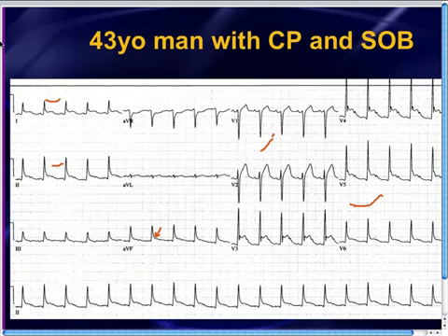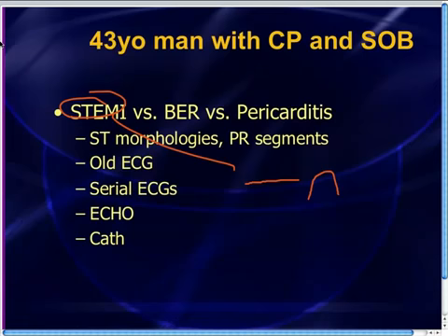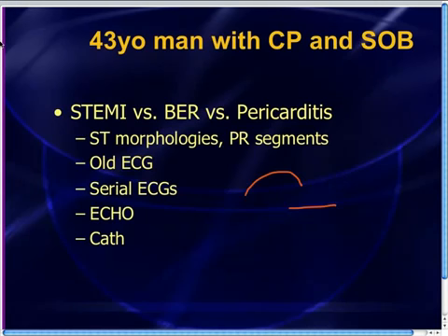So we're going to say that all of these ST segments are fairly concave upwards. Even the ones that are going straight up are just a little bit concave upwards and not more of an oblique type of pattern. I hope you can appreciate those morphologies that I'm drawing there. So there's no convex upward or horizontal ST segment elevation.